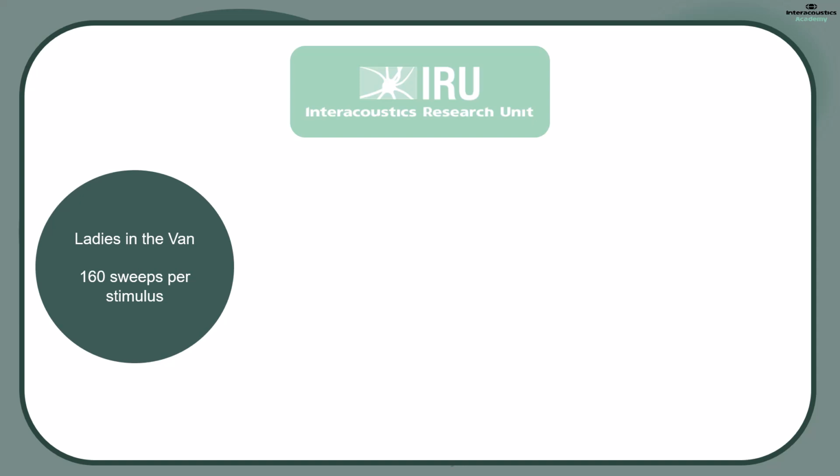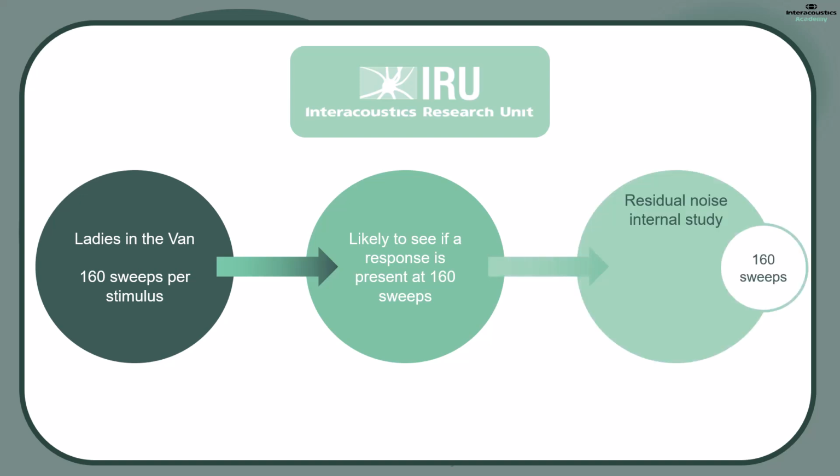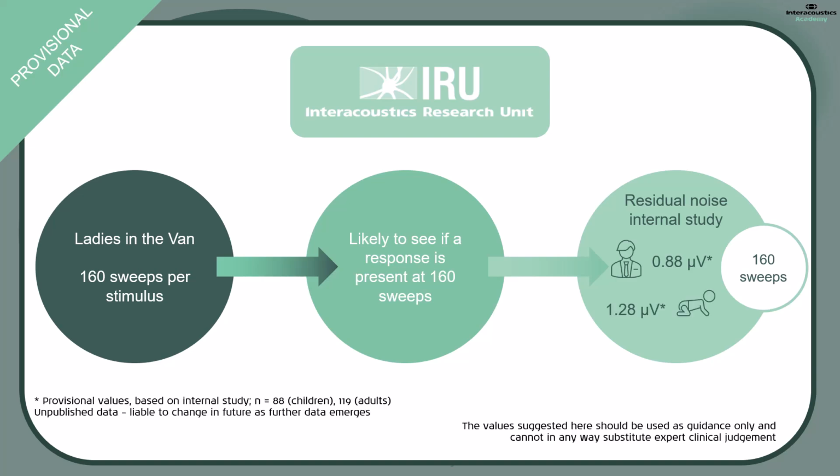So a logical extrapolation is that we are likely to see whether a response is present or not at this point after 160 sweeps. The data analysed by the Interacoustics Research Unit showed that after 160 sweeps, the residual noise value for adults was on average 0.88 microvolts and 1.28 microvolts for children.